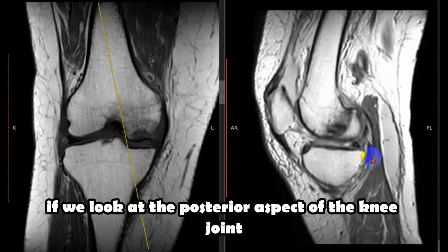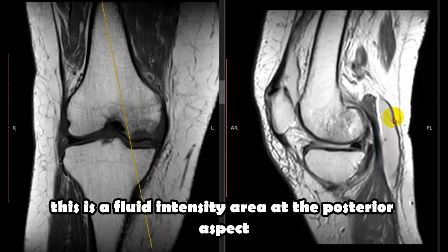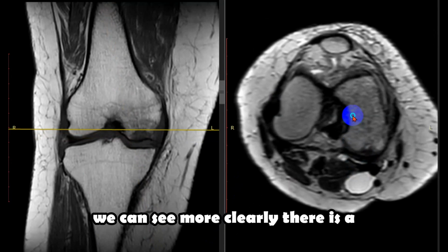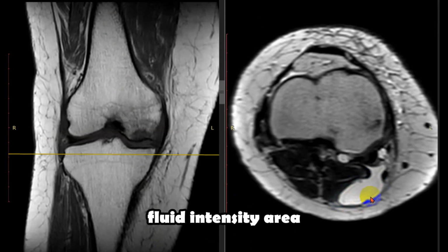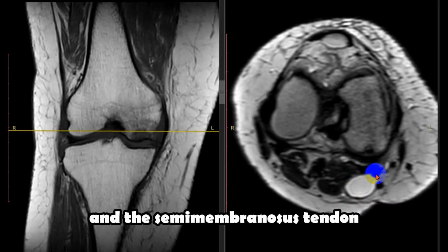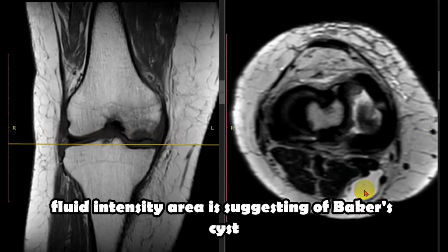And also if we look at the posterior aspect of the knee joint, here we can see this is a fluid intensity area at the posterior aspect. If we look at the T2 weighted axial image, here we can see more clearly there is a fluid intensity area at the posterior medial aspect of the knee joint in between the medial head of the gastrocnemius and the semimembranosus tendon. So this fluid intensity area is suggesting of Baker's cyst.